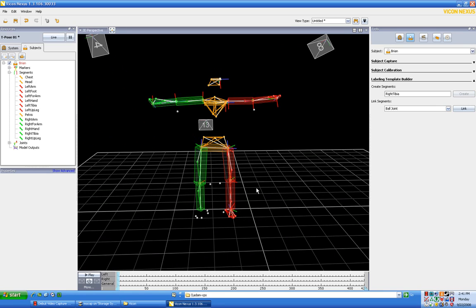Now, you'll notice that what I'm going to do right now is I'm going to roll the wheel up, which is it's going to frame advance, and that takes away my boxes. You want to be careful not to do this. If you come back to the frame 1, where you should be starting on frame 1, you'll notice that it comes back. Try to label everything on the same frame.